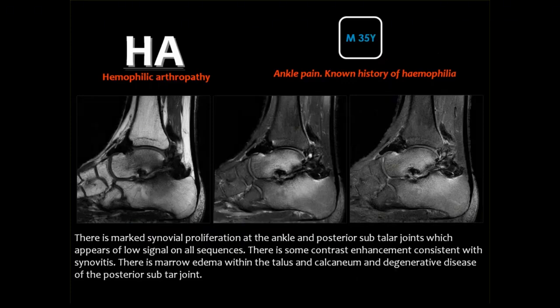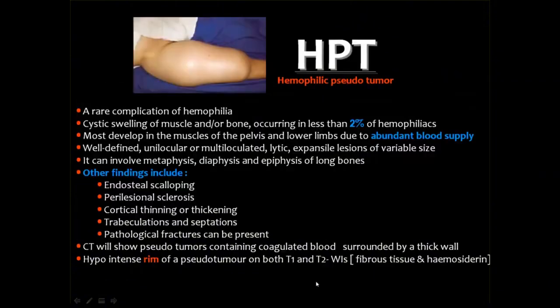But of course, whenever you have MRI and you see these big masses of persistent low signal intensity in all pulse sequences, and if you inject contrast material these masses will not enhance, you are able to differentiate this from pigmented villonodular synovitis, since that synovitis will enhance if you inject contrast material.